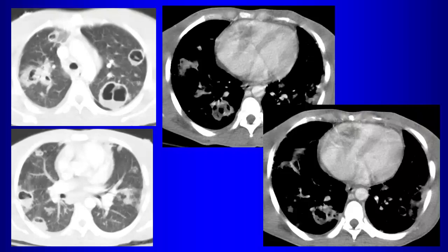Looks like there's, see the, right? Okay. Tricuspid valve. Yeah, so right here near the tricuspid valve, there's this subtle area of decreased attenuation. What might that represent? Vegetation. So then you put the story together as what? Tricuspid valve endocarditis with septic embolism.